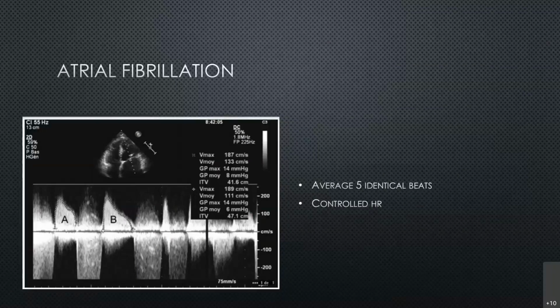So with the mitral valve, it can be very deceiving, because a lot of times the stenosis can be subvalvular. So the valve looks like it's opening okay, but do not get deceived by it. It can be subvalvular. We saw at least a couple of cases recently like that.